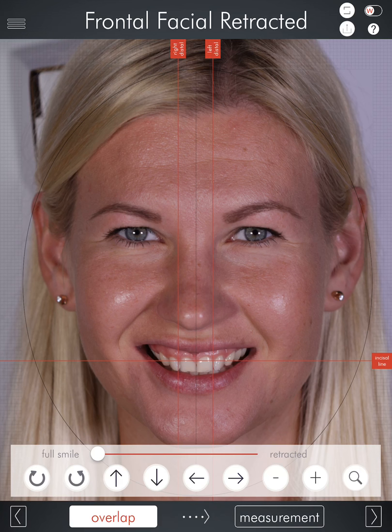Please follow and see the smile simulation video we have created for more information on how to do a simple smile simulation.